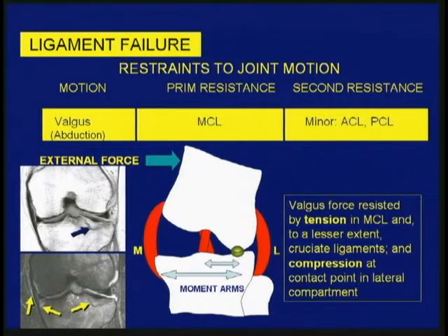And here's the typical example showing you compressive injury with a fracture line in the subchondral bone, most likely an osteochondral fracture. And you can see here that there is a little bit of edema, tensile injury to the medial supporting structures, and even a little bit of tensile marrow edema at the attachment of the deep medial meniscotibial or coronary ligament of the knee. So that's how you put this together with all of these movements.